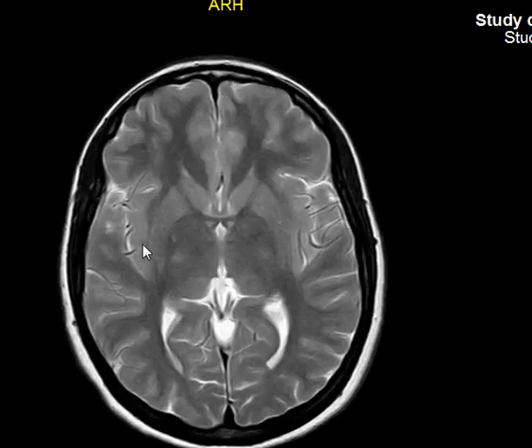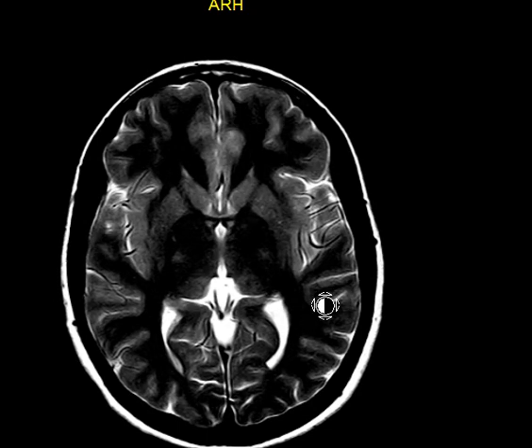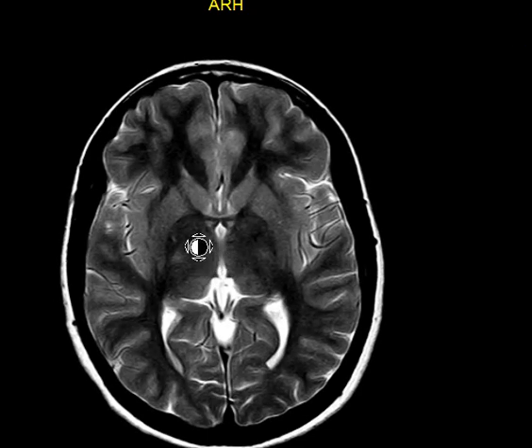At the Sylvian fissure, you notice, if you look carefully, you can see there is gray matter deep within the Sylvian fissure. This is the Sylvian fissure, and there is gray matter deep within it, covered from here and from here. The gray matter comes and covers a deeper gray matter. Okay, this is called insula.